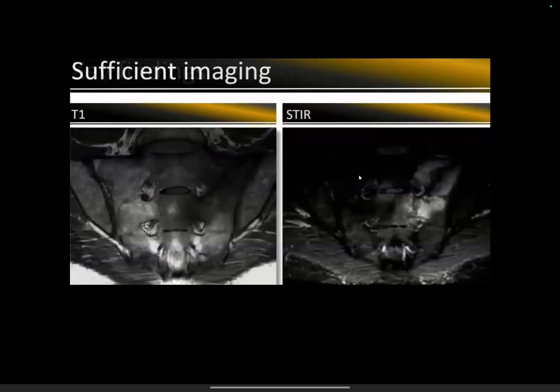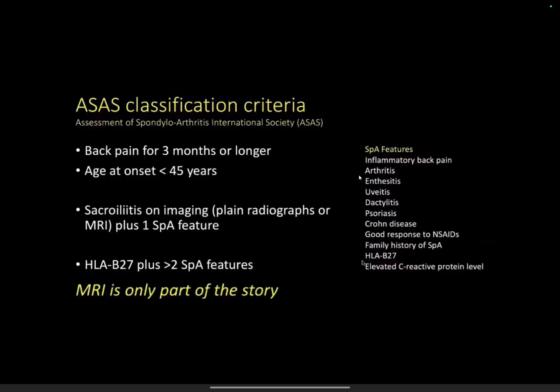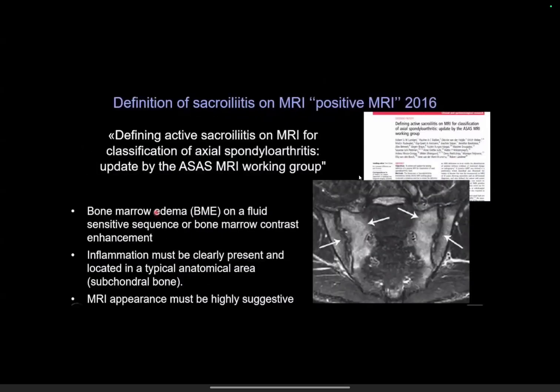Yeah, it was. The initial one was on 2 sequences, this one. Right, either on the same slice at 2 locations, or at least on 2 slices. 2 slices, yeah. This is the article that gives a better, precise definition.